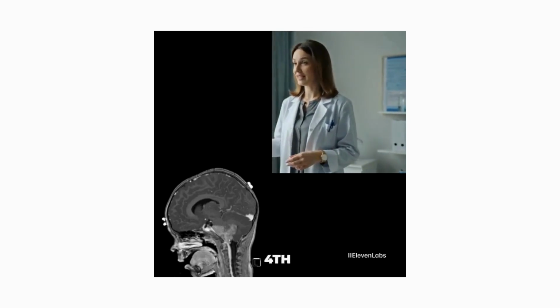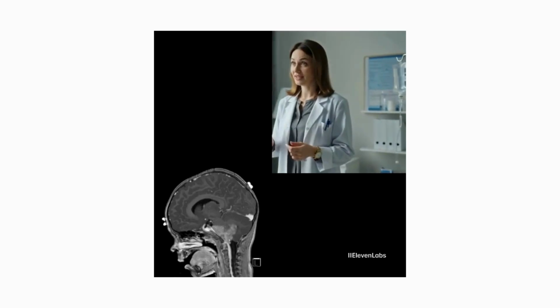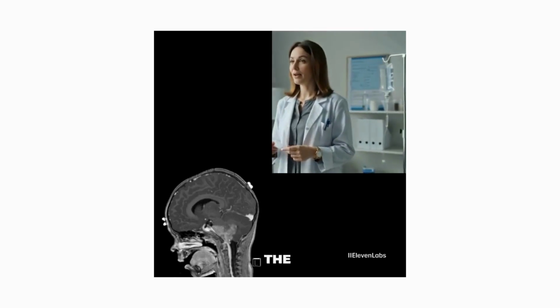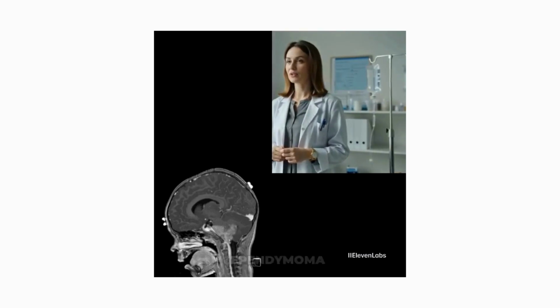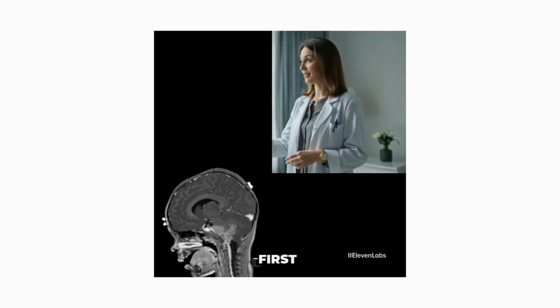While both occur in the fourth ventricle, their personalities on imaging are very different. Location. Medulloblastoma typically arises from the roof of the fourth ventricle, the superior medullary velum, whereas ependymoma usually arises from the floor. This is your first major clue.